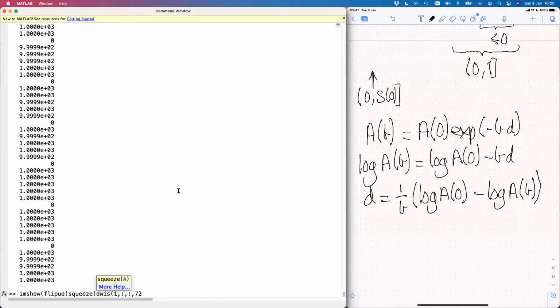I'll just take a slice that's somewhere near the middle, number 72. Then I also need to transpose it to get it in the standard orientation, which has the front of the brain at the top of the image. And then the second argument to imshow, if you just put open brackets like that, it scales the intensity to the full range of values contained in the image array. So let me just open a new figure for this.